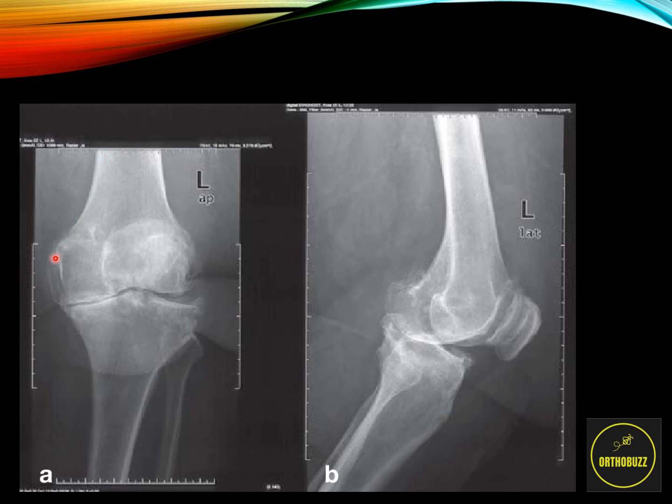Well, we see the same distal femur and the proximal tibia. And if we look at the joint spaces, we see the lateral joint space here is well preserved, as there's a gap between the distal femur and the proximal tibia. In real life, that would be filled with articular cartilage, allowing frictionless movement. If we trace that medially, however, we can see that there's much less of a joint space and that the bone is essentially rubbing on the bone here, a medial femoral condyle with a medial tibial condyle. Therefore, there's reduced joint space on the medial compartment on the anterior-posterior view.